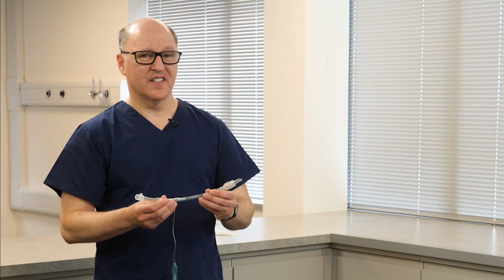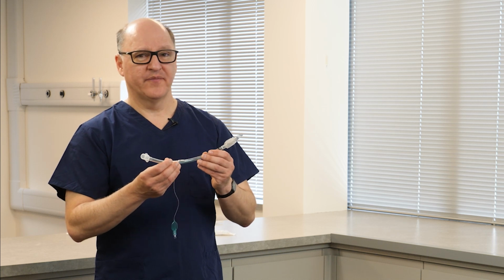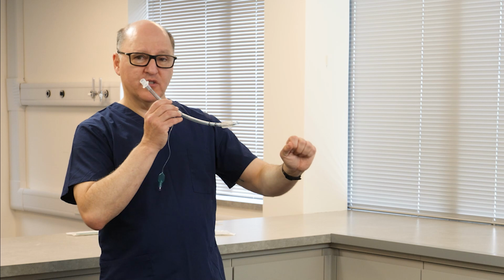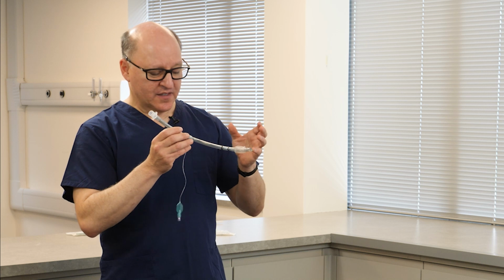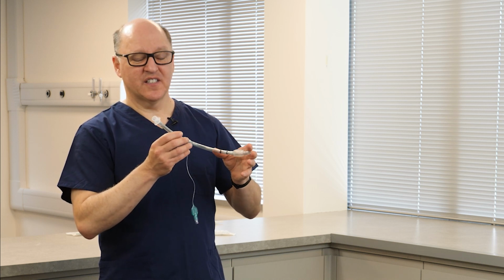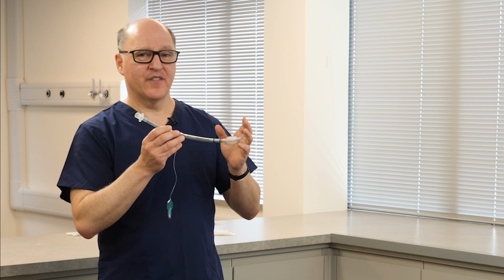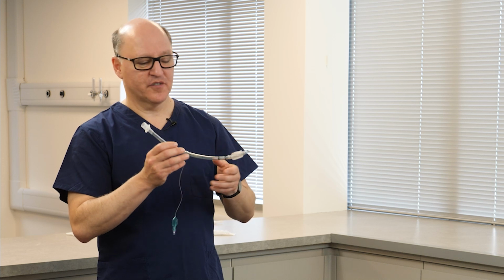The problem of placing tracheal tubes in the trachea is related to the fact that our tracheal tubes are curvilinear. They have a wide side-to-side dimension. And as we approach a target, the tube itself can block the line of sight to that target. So as direct laryngoscopy began to be used in elective anesthesia and resuscitation, it was appreciated that we should have a better means of delivering the tube to the target without blocking the line of sight.